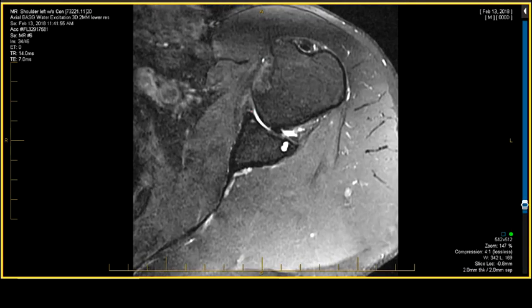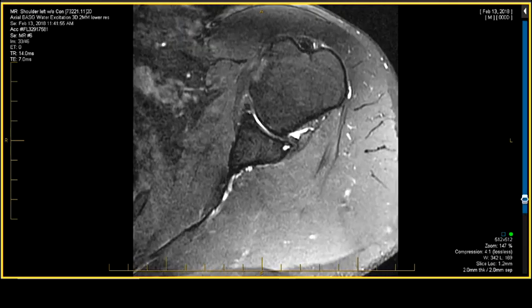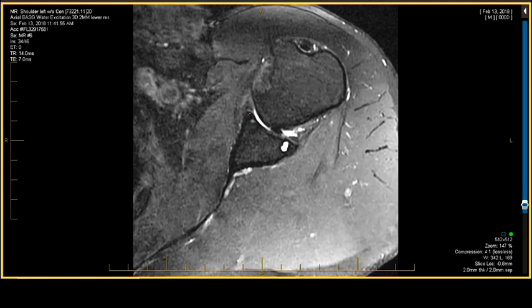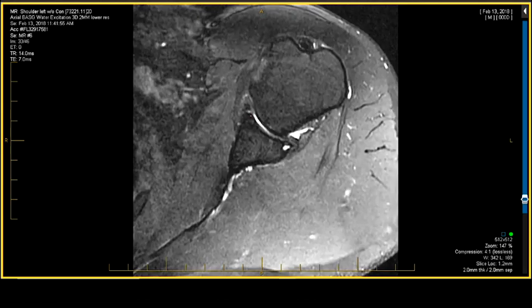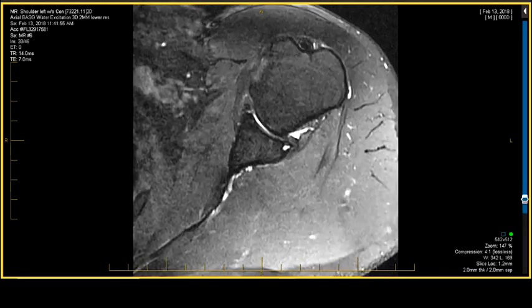I'm also going to comment on these chronic fissure-like anterior labral tears that don't belong there. They're certainly chronic in nature. The patient has not had a dislocation, even though he's had a skiing injury. If he had a dislocation, I'd see a Hill-Sachs. If he had a dislocation, I'd see swelling here.